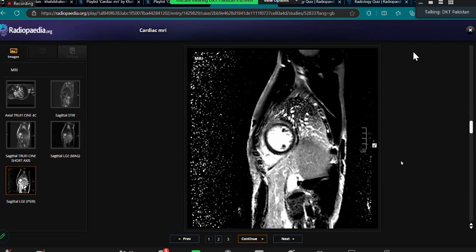Radiologists also report cardiac MR. What I am saying is, your description is good. Your diagnosis is incorrect, but still the examiner will pass you, because your description is good. You talked about the right things. You referred the case.